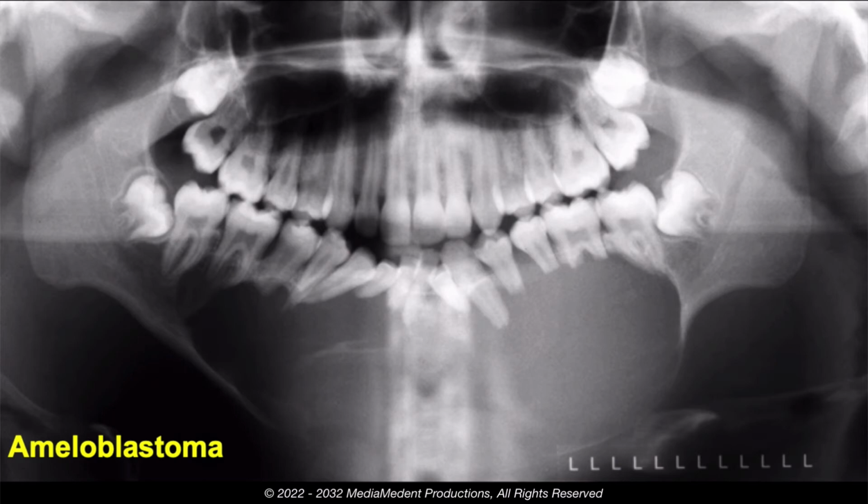A biopsy returned the finding of ameloblastoma. Ameloblastomas may be of the solid or cystic type. The cystic type may develop as a single entity or may arise from the epithelial lining of a dentigerous cyst. The presence of a cystic variant may allow for the return of fluid on aspiration and may prompt the incorrect impression of a cyst. Unfortunately, it is not possible to distinguish between solid and cystic types on radiographic examination.